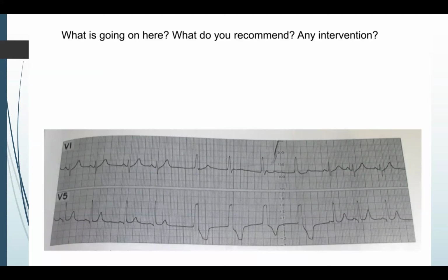I think if he's asymptomatic, it can be normal if he's sleeping. Yeah, I think that's right, Mo. I don't think we would generally do much about this. I think we could make the argument that this is a normal observation. Or maybe I would say it's an abnormal observation, but not a particularly dangerous one. We don't normally see this, but on the other hand, I'm not sure what this means.